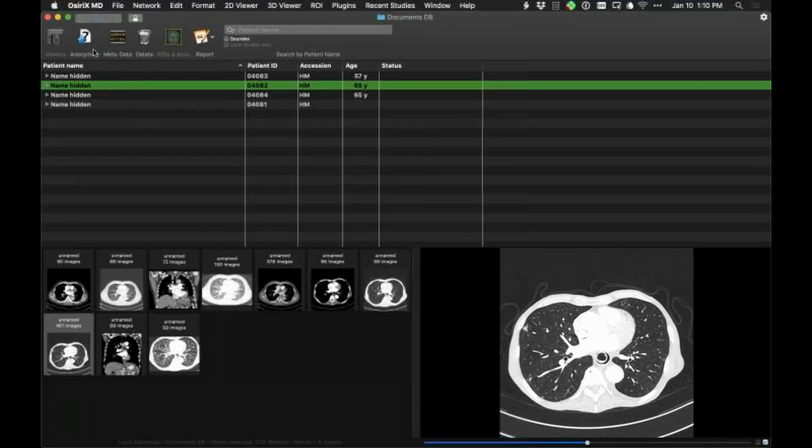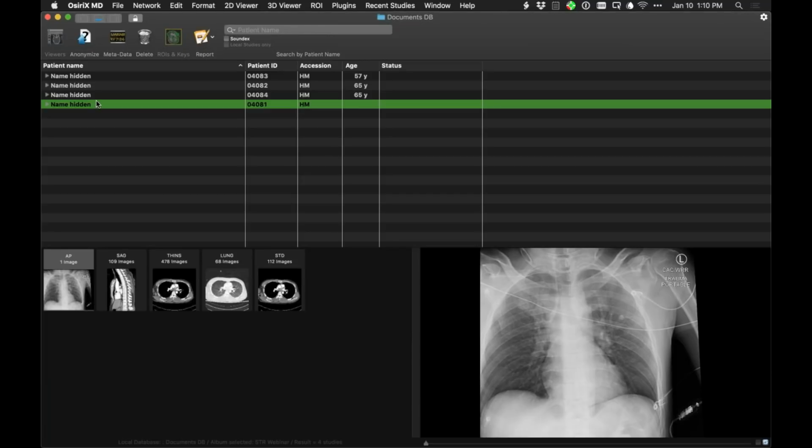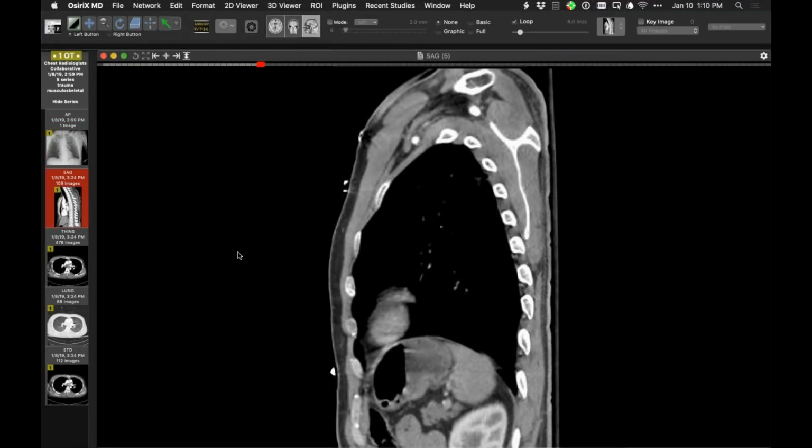All right, let me show you some other interesting ones. I'll get to that one in a moment. This one is a quickie. It just so happens that, I think it was 2 weeks ago, that I showed that really interesting patient with the complete manubriosternal dissociation, where the manubrium was anterior to body of sternum completely with no associated fracture. This is a trauma patient that has a minor version of that same thing.